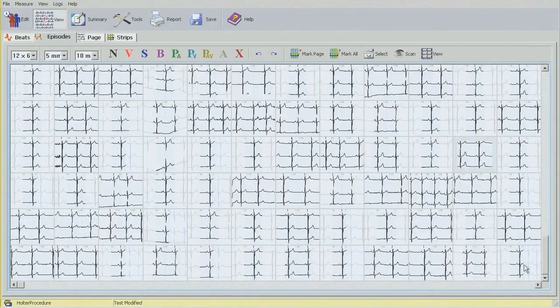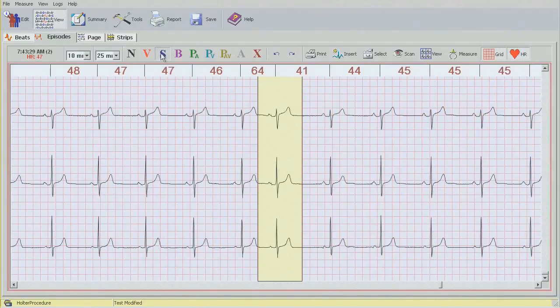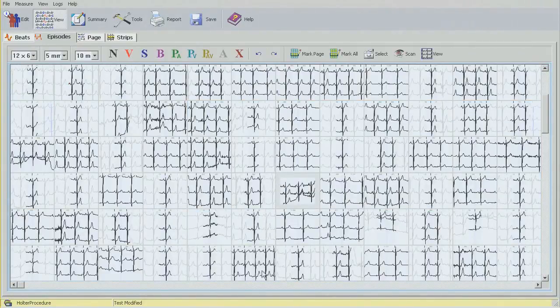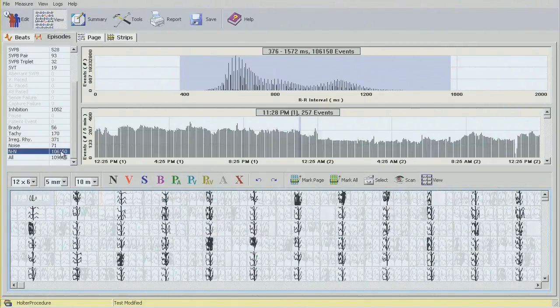And again, double click on the last box, scroll it all the way down. Another early beat. Double click to see the rest. And everything else seems to be okay. So again, using the Z key, I'm going to go back. So again, we've increased the number of runs to 19. Now the last thing to check here is the NN, starting with the longest one.